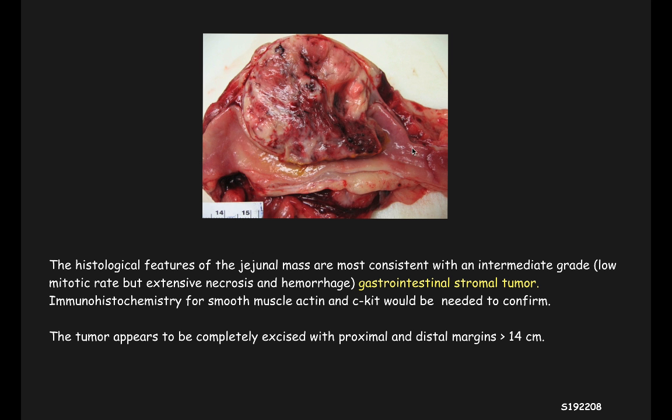We can even see the fold of the lesion as it is distorted by this large mass, which is primarily eccentric. The histopathological diagnosis of this lesion was gastrointestinal stromal tumor, although immunohistochemistry tests were recommended to confirm this suspicion.